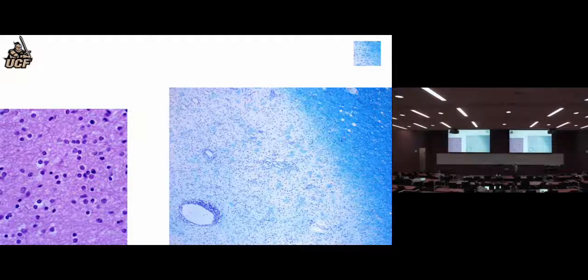And you can see those same myelin strands, but then you can see there's very few of the myelin strands here. On the lower power, you can't see it. The lower power is so you can sort of see the difference between the area that's good and the area that's demyelinated here. But then if you want to see the little myelin strands, you can see them a little bit here, but it's better to look at a higher power.